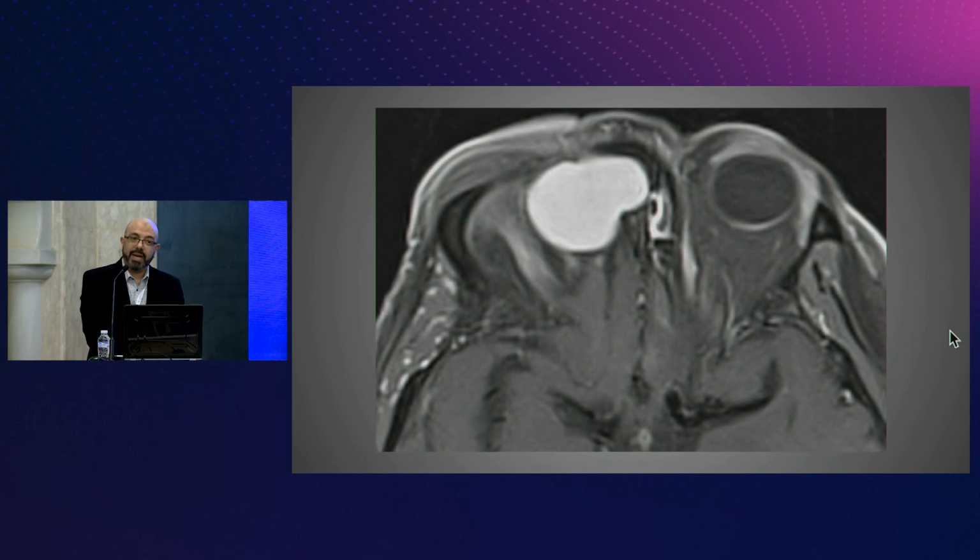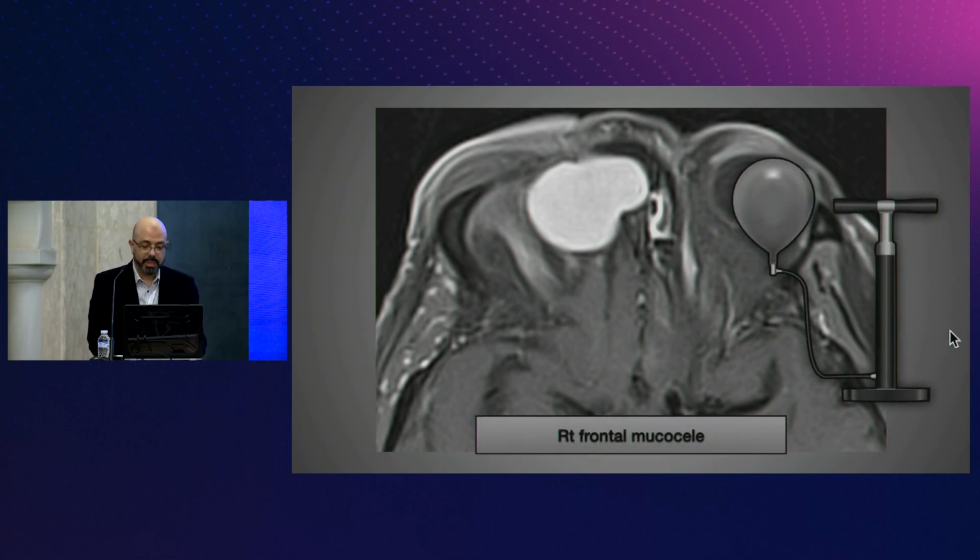And you need to give GAD if you suspect that there is a mass. Oh, is that a fire alarm? No? You need to check that there's no mass blocking the sinus, right? There's nothing there. And of course, because of high T1, you will not appreciate the enhancement that well anyway. So this is expansion, so this is a mucocele.